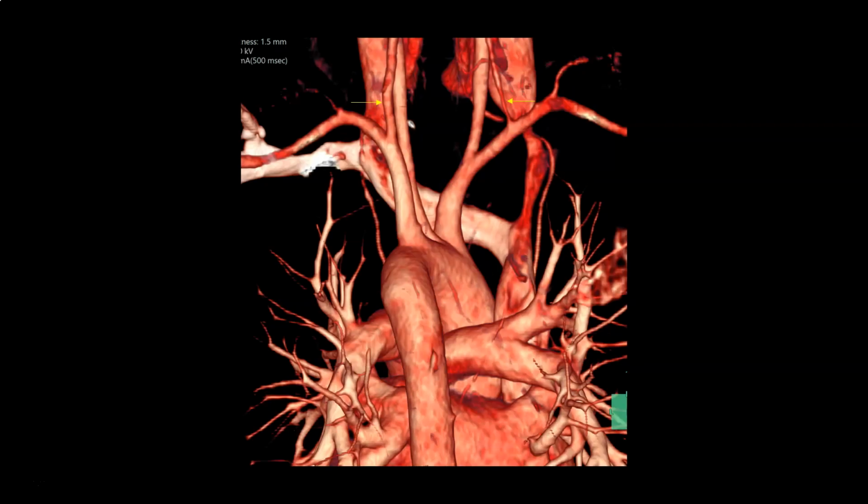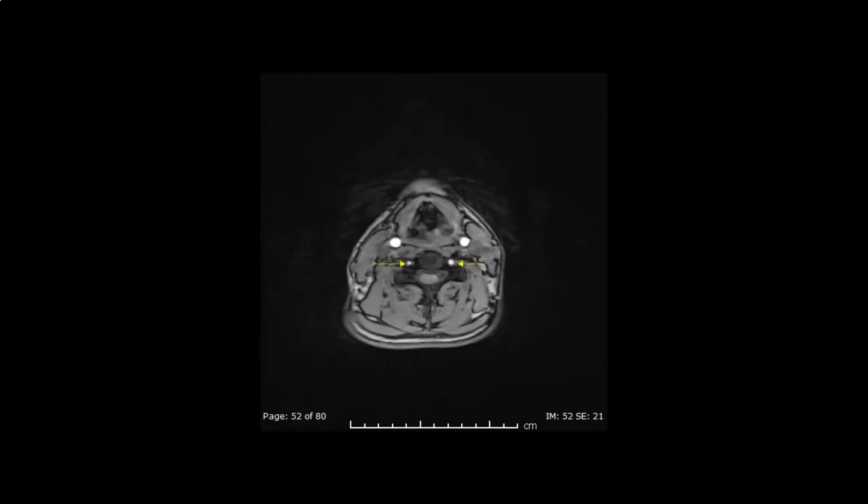Now you see the right vertebral artery on your right-hand side because we are looking from the back. Notice how it is stenosed in relation to the normal left vertebral artery. And because sometimes there is discrepancy in size between the two vertebral arteries normally, we have to look at the flow in the vertebral artery to know if this is just a normal variant or it is due to the entrapment of the artery at its origin by the fibrous tissue.